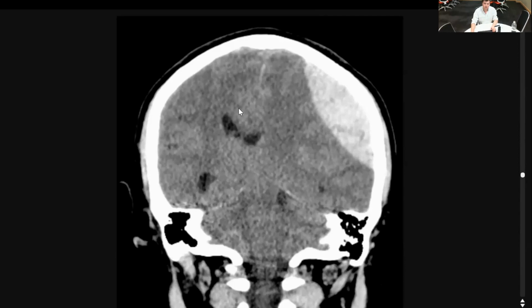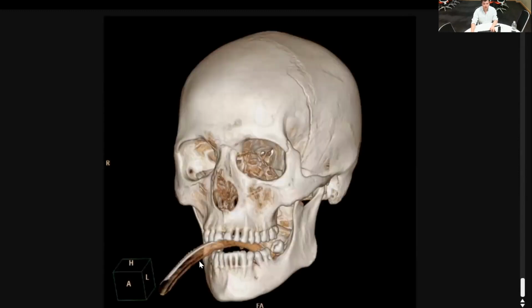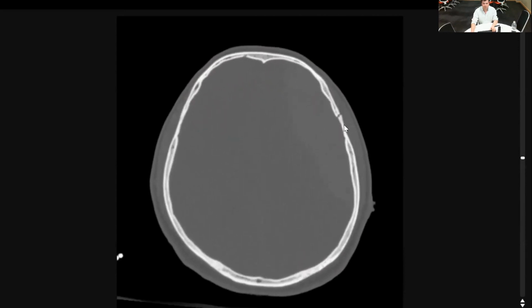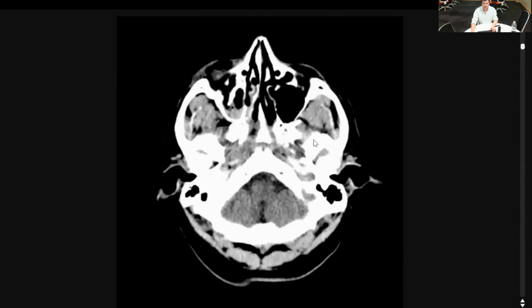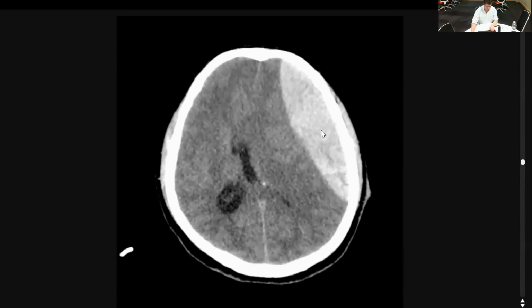because this is just to show as well, we've got another view. Look at all your other views. Look at your coronals to show the midline shift. And they're also tubed, and they've also got the fracture in this same area that we'd be looking at. So this fracture is ripped through the bone, ripped through the suture, and has come down in the pterion there. And you can see underneath that, that's where that blood is just filling this extradural space.